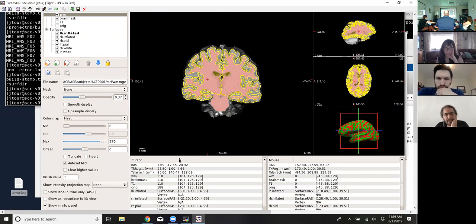One question: how does it know to show you the pial and white surfaces on the structural data, but not the inflated one? Is that based on the name of the file? You mean over here? No, at the bottom right it shows you the three of them, but in the big one in the center, it's only showing those two.